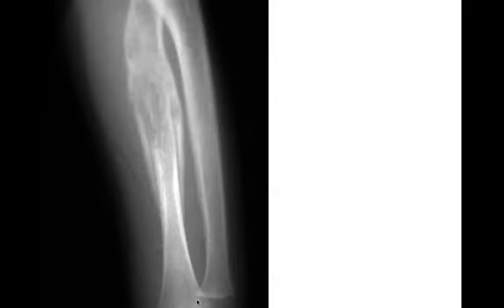All right, this is a child in this case. We see there's this geographic lytic lesion with a wide zone of transition right here, and around the lesion we see this solid heaped up periosteal reaction. The periosteal reaction is fairly non-aggressive appearing, even though the lesion itself, because of the wide zone of transition, looks a little scarier. So I think it's reasonable to consider more infiltrating processes such as a lymphoma or an Ewing sarcoma or infection. This case turned out to be a Langerhans cell histiocytosis, or EG, in the bone, but a less aggressive, solid periosteal reaction appearance.